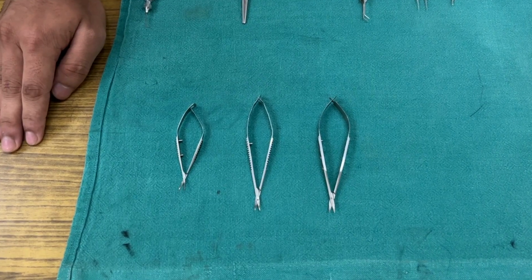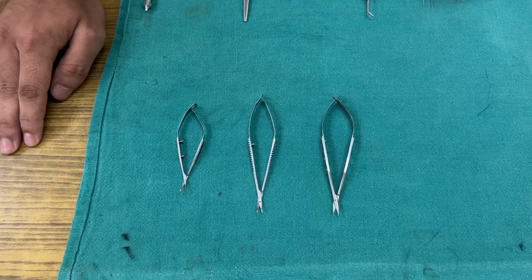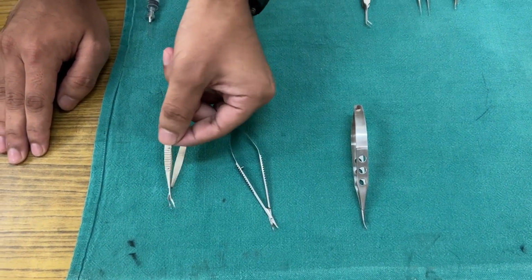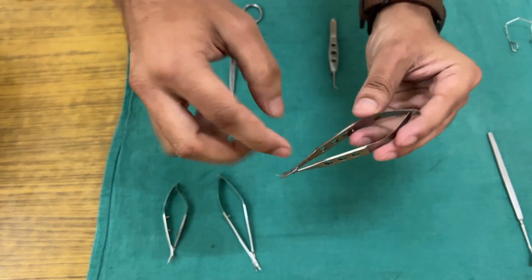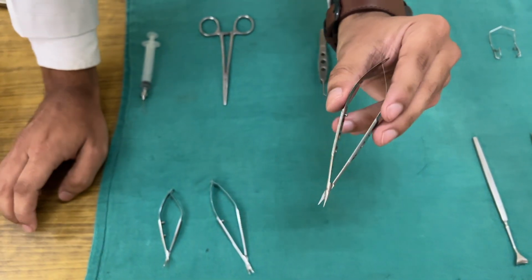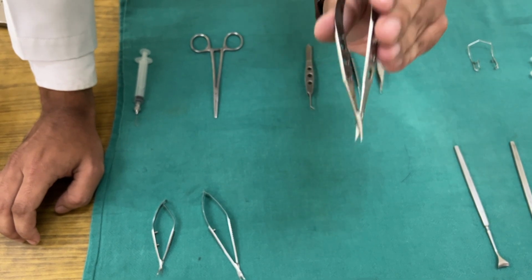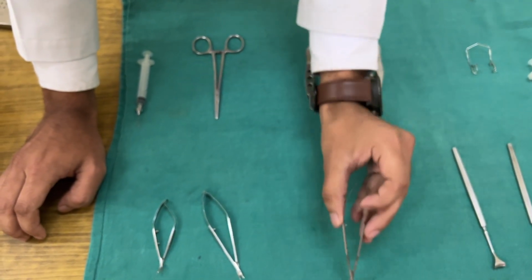So these are different scissors that we use in ophthalmology department. So we can see there are three specific types of scissor. One of them is corneal scissor. This is our Westcott scissor, and this is our Vannas scissor. So let us begin with corneal scissor. You can see that in this corneal scissor, the gap present between the two limbs is very much. Because of this there is a large pliability, and we can increase the sections within the cornea, within the scleral incision. So it is also known as section enlarging scissor. So you see the movement, it has a large variety of movement.